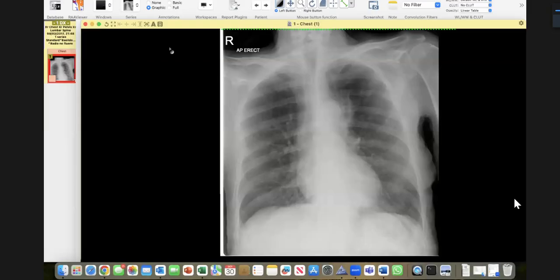Okay, so I am presented with an AP chest X-ray of a 60-year-old female patient complaining of chest pain and weight loss. I'm examining the most striking abnormality for me, a thickening of the right paratracheal stripe, I think. Can I stop you there? The right paratracheal stripe is thickened because of a bit of rotation, so don't worry about that.